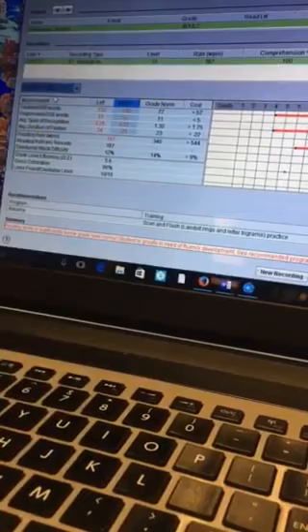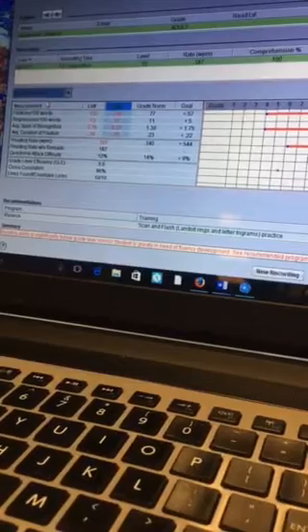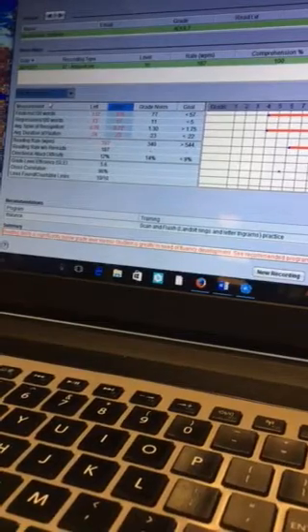So when we look at the number of times your son was pausing, grade appropriate for him would have been 77 pauses in this passage. Your son had 132 pauses with the left eye and 138 pauses with the right eye. So that reading is more fragmented than what we would like to see. And we're seeing that left and right eye aren't always moving together at the same time. There's no amount of attention or concentration and focus that can change that. That tells me that we're struggling with that coordination, that synchronization between left and right brain.